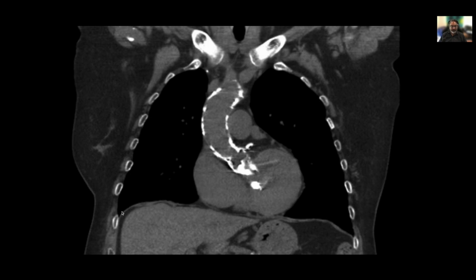Absolutely. And here you can sort of see the diaphragm more clearly than you could in the CT that we're seeing. So you can see it on that side. So you can actually tell the difference between the liver, subphrenic spaces, and the diaphragm. And the pleura obviously is attached to the diaphragm, so you can't really see the difference, the interpleural space.